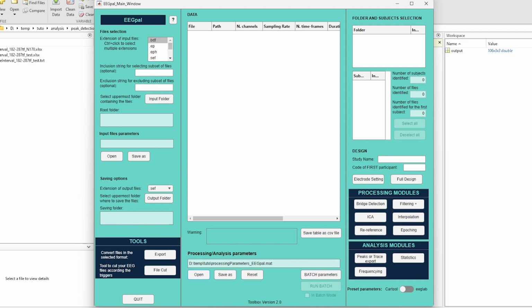When you want to explore the difference inside of your dataset, you can make a statistical analysis over your tracks. It corresponds to making a test for each time point and each electrode you specified. It is done in two phases. In the first, you will need to specify the experimental factor and condition using the full design windows. And secondly, you will configure the test to perform using the statistics model. This one will permit to perform one of those statistical tests depending on your input data.